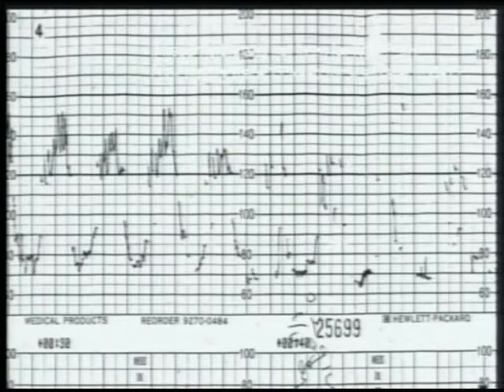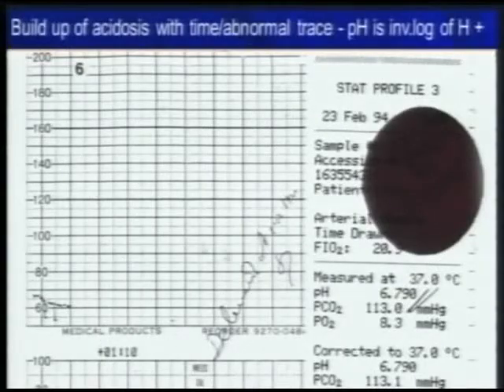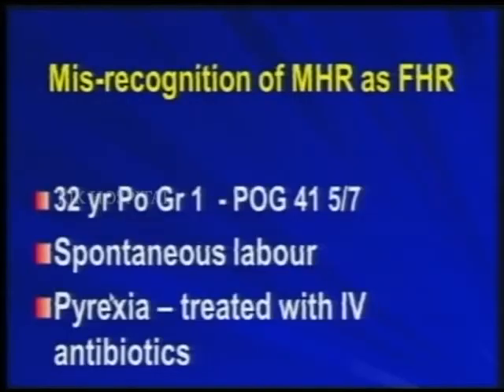And something should be done, because it is not going to pick up. And here you can say this will be about 6.90, and once the baby is delivered at 1:12, as predicted, the baby's pH is 6.8 and the base excess is minus 19. So in subacute hypoxia, by 30 to 45 minutes, you have to deliver that particular baby.